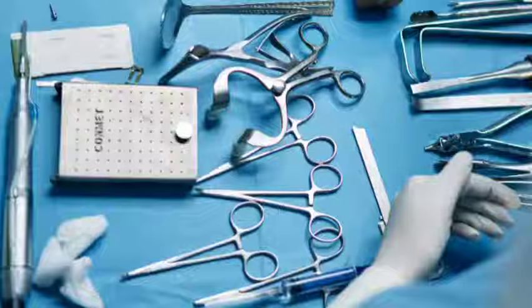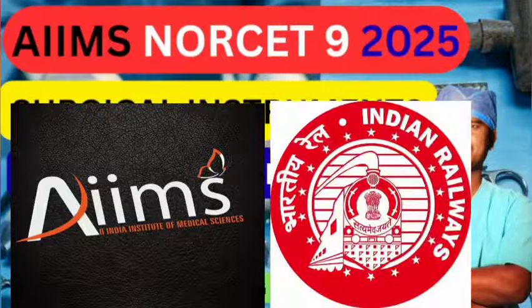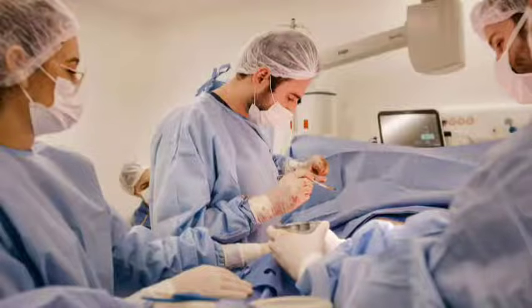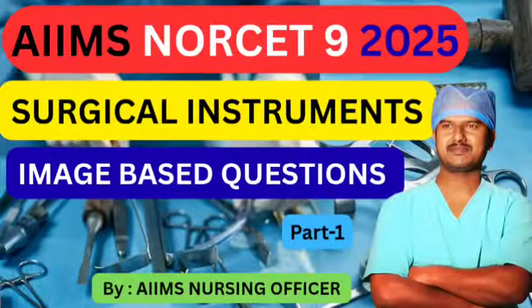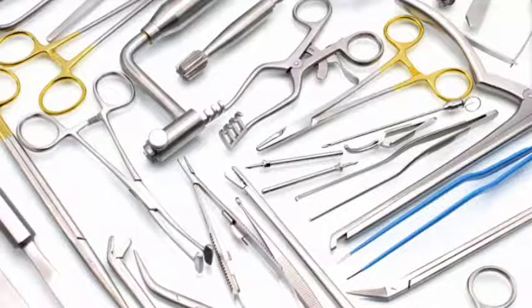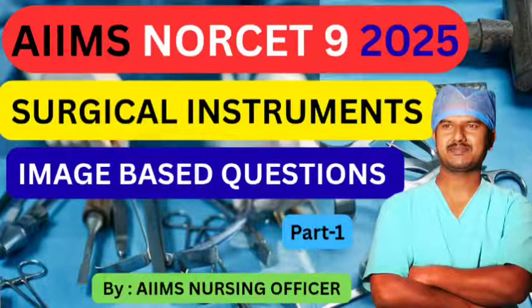Today's class is on surgical instruments and their uses. If you are preparing for NORCET, RRB or any other nursing exams, or want to build your clinical knowledge, this video will help you. Myself Rakesh Kumaran, working at AIIMS Hospital. In this video, I will cover important surgical instruments like retractors, forceps, dilators, scissors, etc. So let's get started.